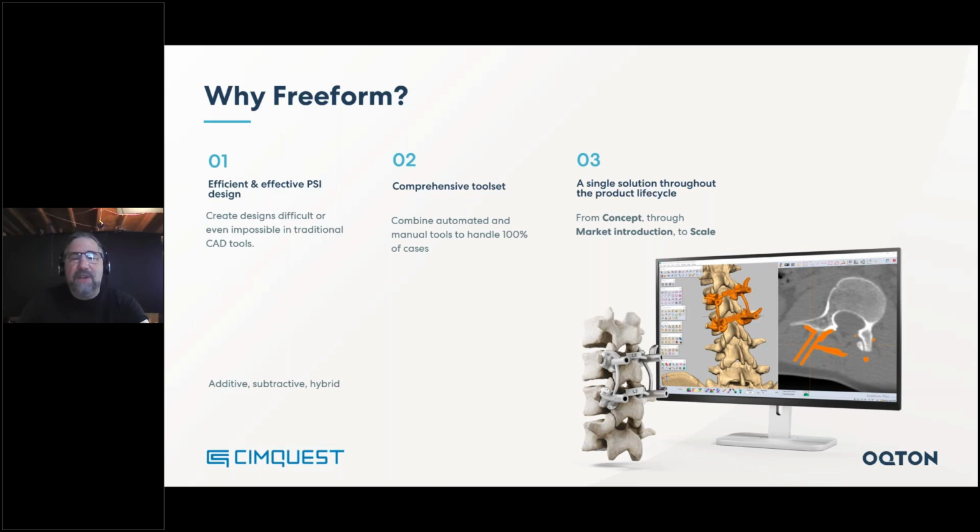Your product lifecycle can live within Freeform depending on where you are in your design, and there's no reason to ever leave Freeform. So it supports you throughout the entire lifecycle. When you're concepting, you require a solution that's flexible, easy, no restrictions, and you can make your concept with absolute freedom. Once your design is set, you can then introduce it to market.